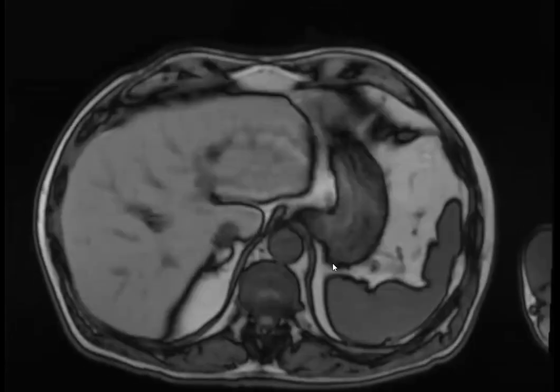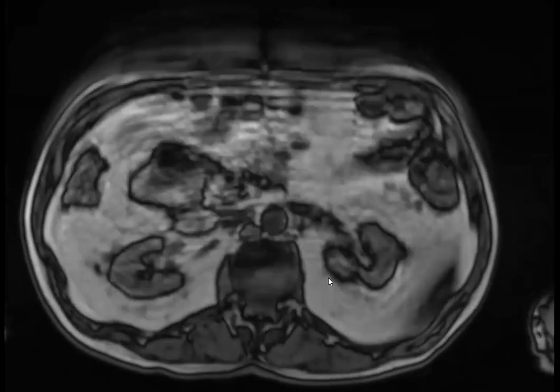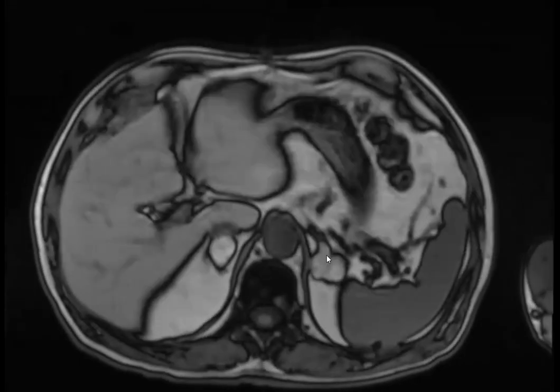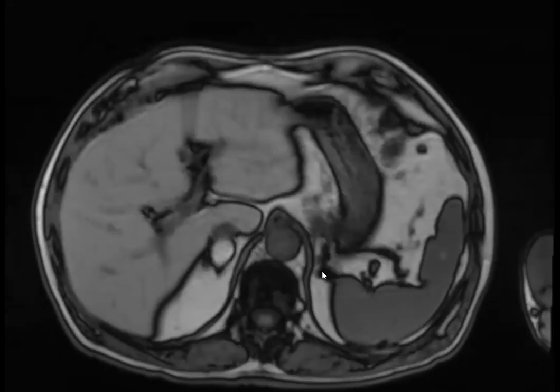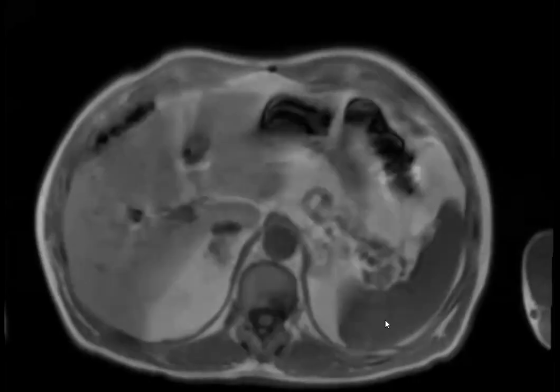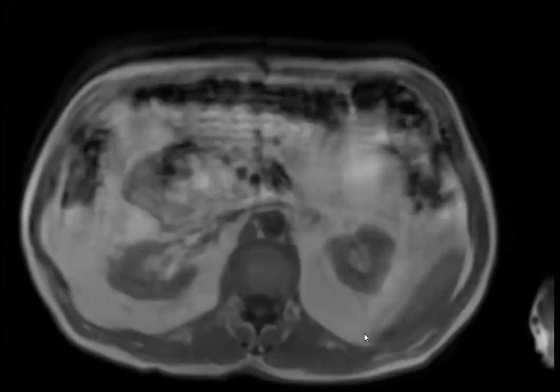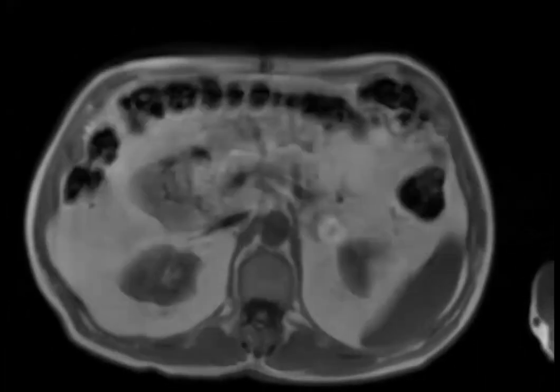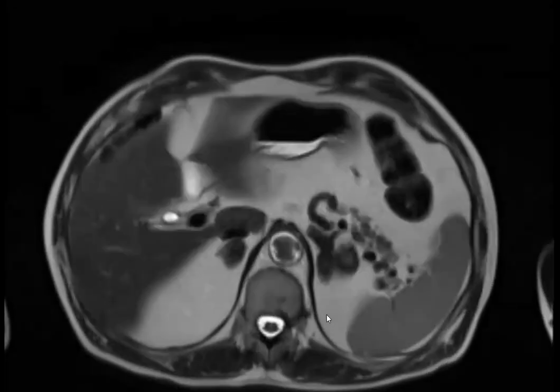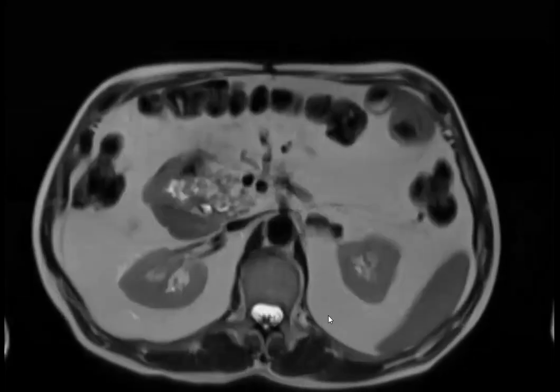Sorry, yeah. They are not really dropping in either one. So they don't have intravoxel fat, so these are not adenomas. And also they are not dropping on the in phase. So it doesn't seem like it's just iron, hemosiderin, metal, or air. But they are very T2 dark. Is there any other sequence you want me to show you?